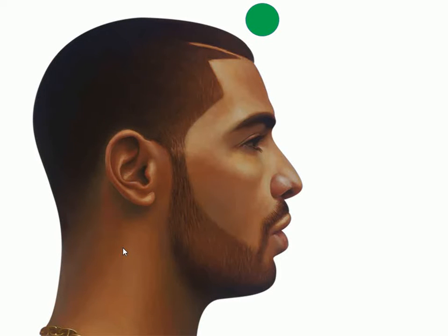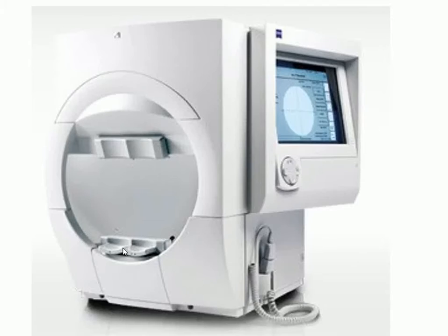So in the examples that I've been giving, where we've been trying to determine the size of the visual field, here the stimulus moves, and we identify where it's first seen. This is an example of a kinetic stimulus. This is the sort of stimulus that's used in Goldmann visual field testing. But in the most used tests nowadays, the automated ones, for example the Humphrey test, it's a static test. So let's just try to picture what we mean here.